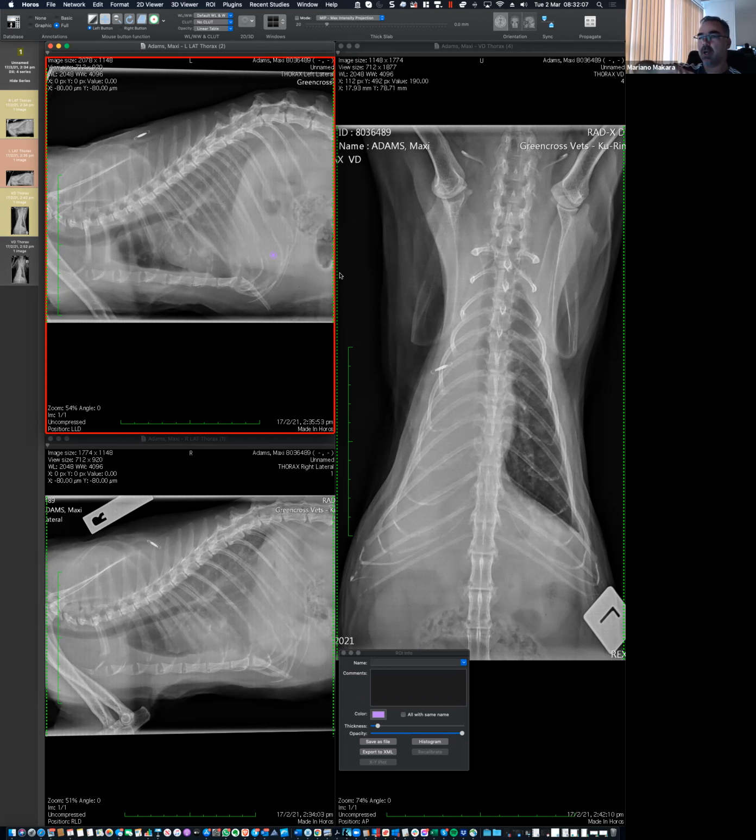I'm still going around the idea, which kind of disease process can result in the whole right lung, all the lobes in the right, being white? Would things like, so yeah, you already said hemorrhage, so I guess that could be things like a contusion from trauma. I mean, there are no rib fractures, so I'm assuming trauma's a little bit less likely, but possible.